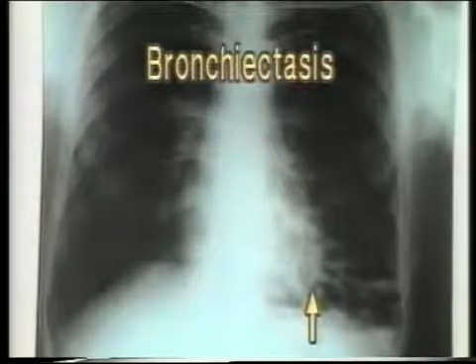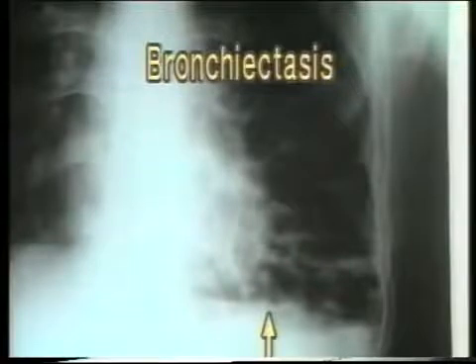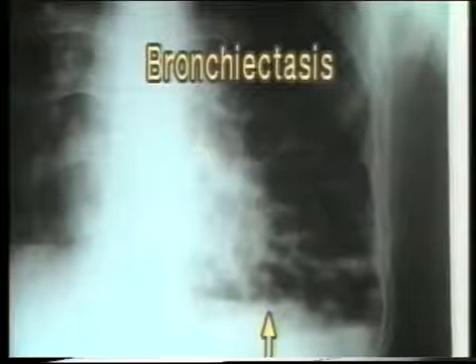Note the multiple thin-walled cystic areas in the lower zone of the left lung. The cysts in dependent areas shown by the arrow contain a fluid level indicating retained bronchial secretions. A definitive diagnosis can, however, be made only on bronchography.